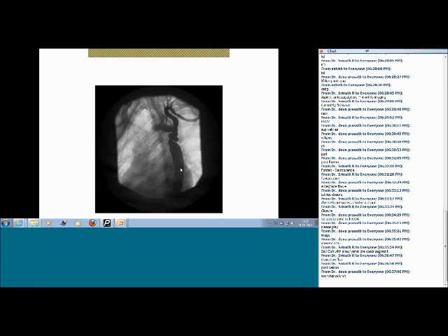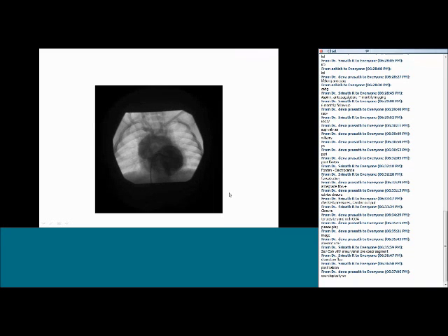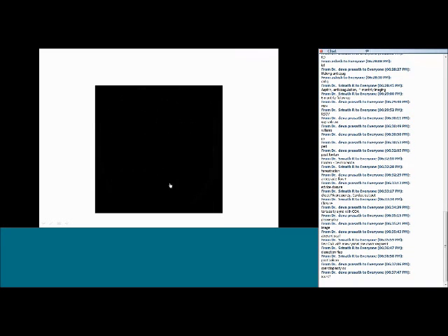Yes. No, maybe not. Usually in surgeries you don't see this sort of aneurysm. It is probably a post balloon. It's probably a post coarctation balloon, and you can see a nice aneurysm. So this patient, if it comes back to you, definitely don't recommend repeat balloon coarctoplasty in this patient. Only option for this patient is surgical repair.